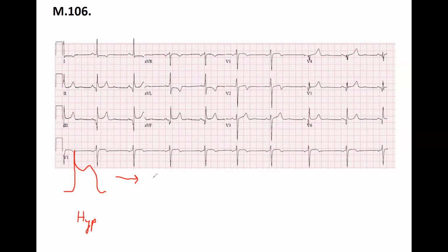Later on, what will happen? If you close the coronary, the further area that the coronary is supplying doesn't have enough oxygen, meaning necrosis starts to develop. So we develop a Q wave. And what we have is a Q and an ST elevation. Okay, this is what we have. So Q and ST elevation. Here we had only ST elevation.